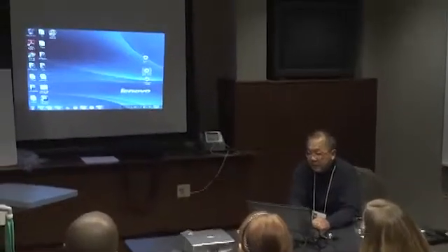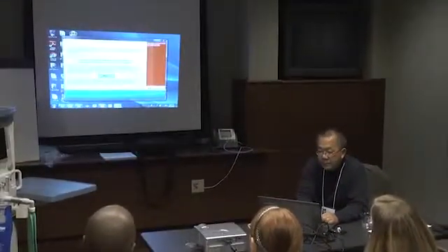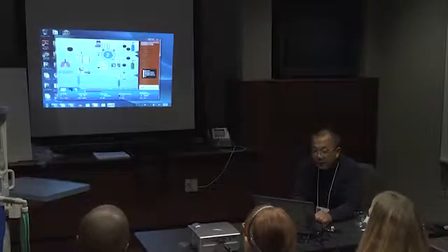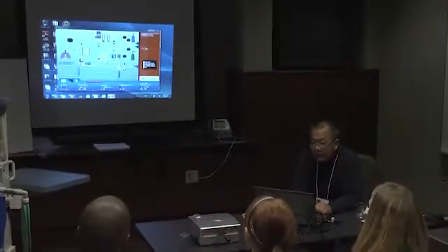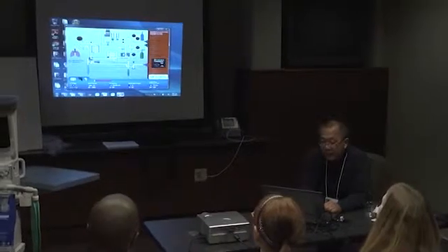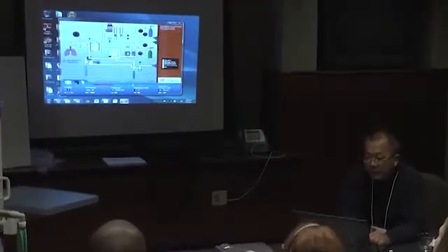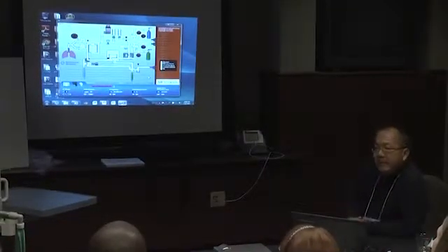The surgeon made the incision 10 minutes ago, and the analyzer alarm sounds. I'm going to set up the simulation for you. Since you have used the VAM, I don't have to explain what I'm doing. I'm turning up the nitrous. I'm going to hide the gases, turn on my ventilator, and initiate the fault.